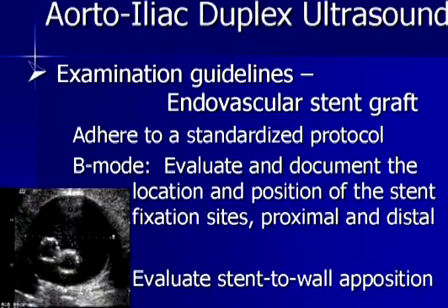As far as post-intervention studies, I want to focus most of my talk on the endovascular stent graft patient. Again, adhere to a standardized protocol. This is particularly important in these patients as they've had a complex procedure, and there are a number of things unique to endovascular stent grafts that you want to try and look for and measure.